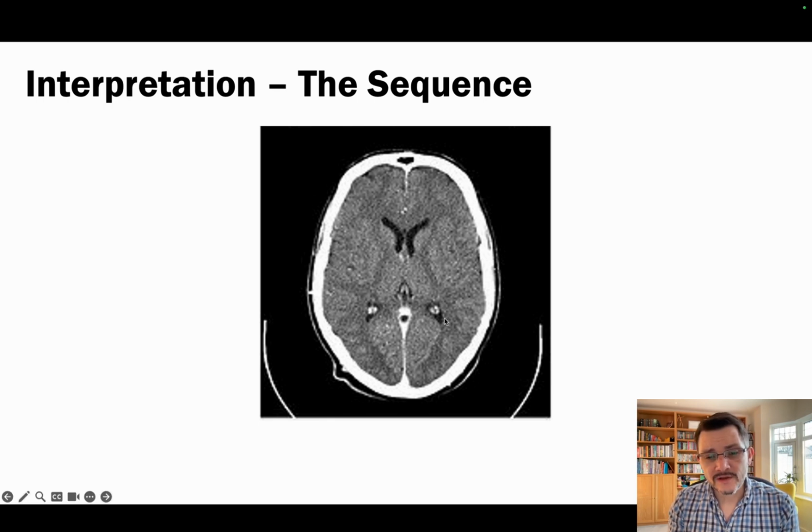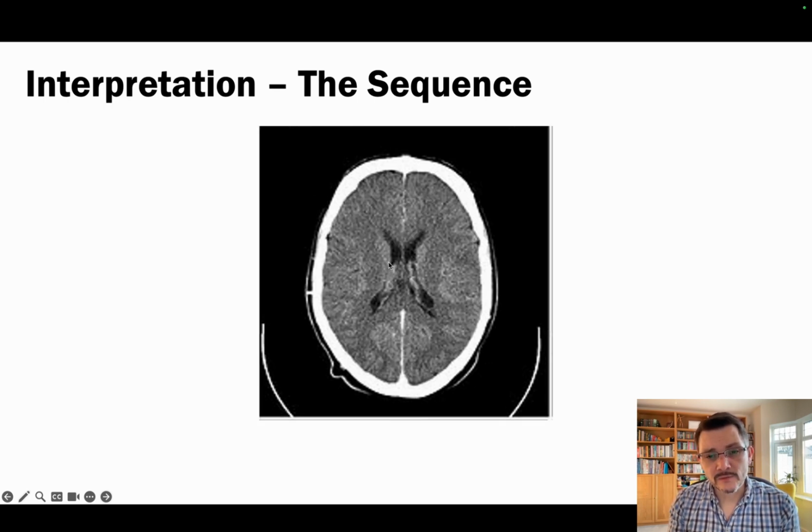Ventricles progressing, you get again larger here, the lateral ones. So you've got 2 lateral ventricles, as I've already alluded to. There's this little C shape or banana shape on the side. And then if we go a little bit higher again, this is a key area for the stroke physician, because if you look at this region, we've got the thalamus, as we've discussed previously, we've got our ventricles, we've got our frontal lobe, we've got our parietal lobe, we've got our occipital lobe. So this slice alone would be quite a good place to go to for a lot of lobe pathologies, but you couldn't just look at one slice, you need to look at all of them in unison.